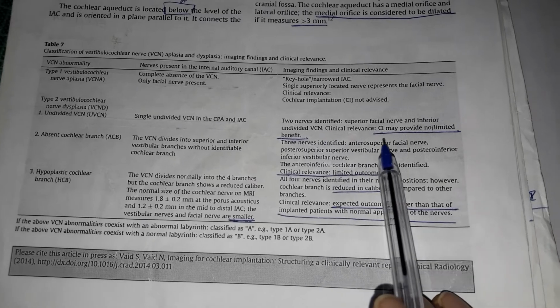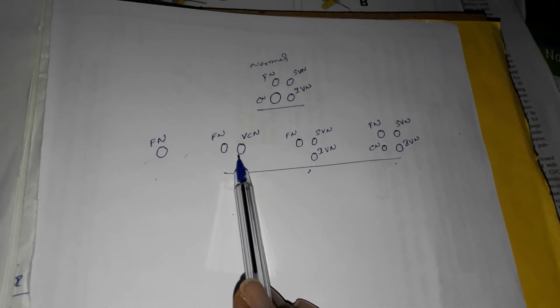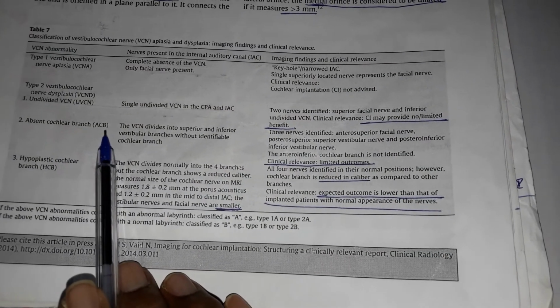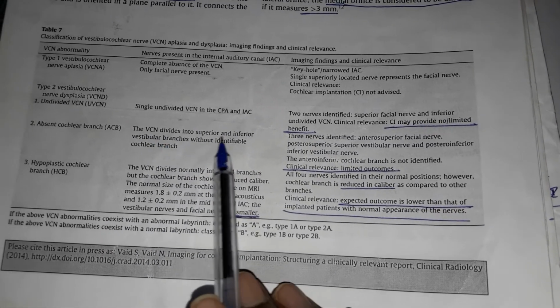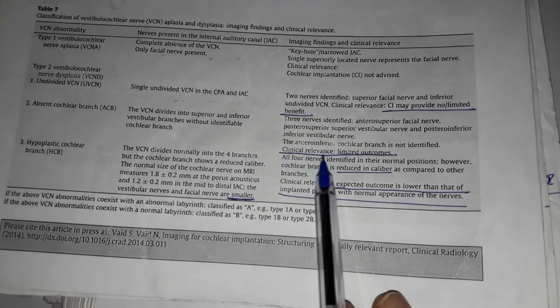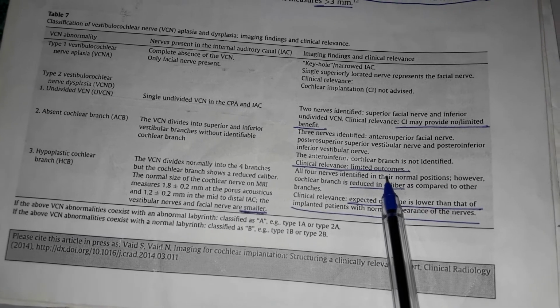Cochlear implant may provide no or limited benefit, because some surgeons say that cochlear nerve fibers may go through this vestibulocochlear nerve. Here is an absent cochlear branch, which means the vestibulocochlear nerve divides into superior and inferior vestibular branches without an identifiable cochlear branch. Here again, the cochlear branch is not identified. Clinical relevance is limited outcomes.